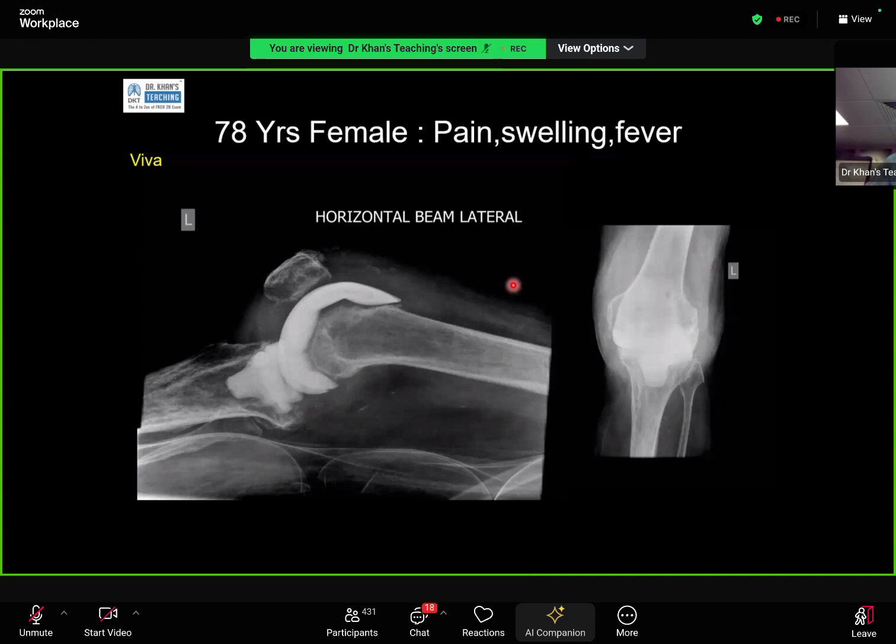Proximal tibia, yes, sir. So don't worry, this is all a bit of osteopenia, etc. Don't worry about the tibia. Okay. Other than that, I can see lytic areas involving the patella. Patella. Okay, so this is also osteopenia. Don't worry about this. What else?